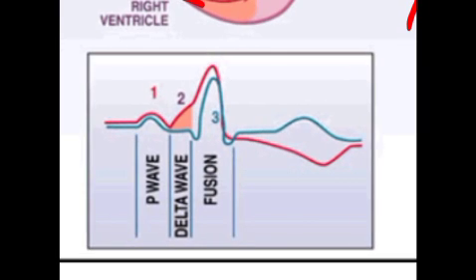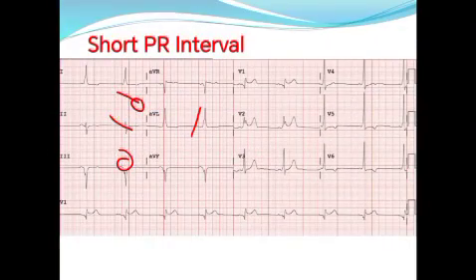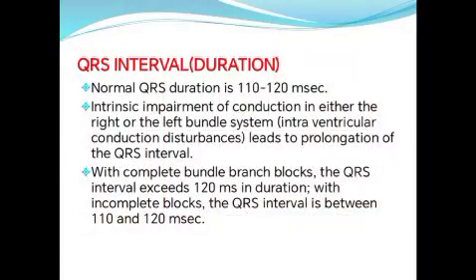This is a short PR interval, and this is a delta wave. Okay, this is one cause of the short PR interval.